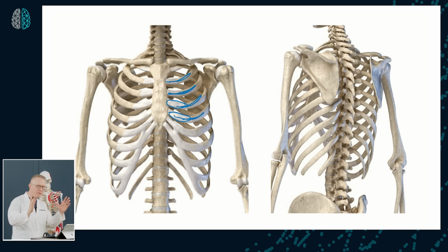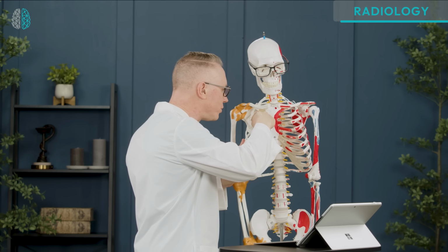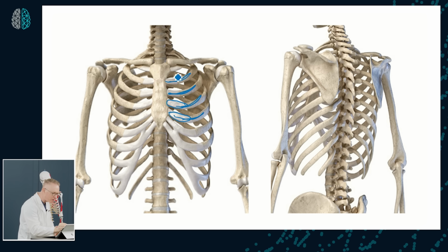And they're curved, almost look like whiskers, which we'll talk about in a minute. But you see behind there, you've got to look through the ribs, and you see that the posterior aspect of the rib looks different. They're back here behind, going in a different kind of direction, okay?